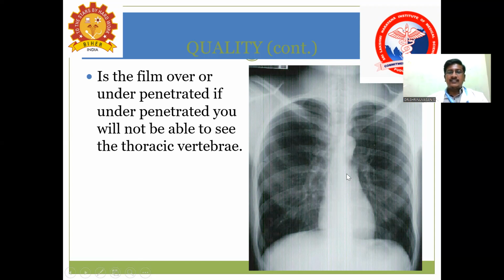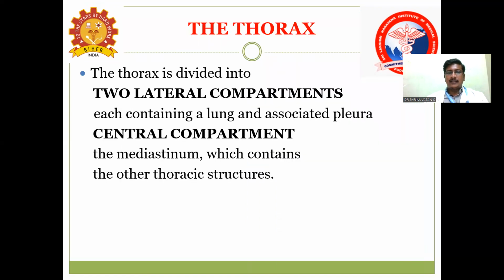Like this, you can assess the rotation. Patient position is correct. Patient has taken adequate inspiration. But then whether the technician has used proper KVP and MAS techniques, these things you can assess by seeing all these parameters.